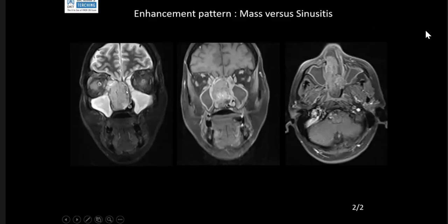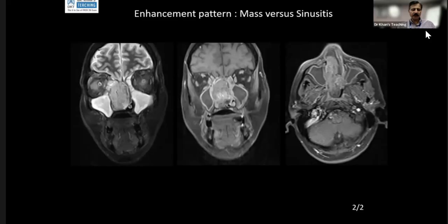This is actually the nasal, so the nasopharynx. This is, I thought it's a nasal cavity. Nasal cavity, yeah, okay. So the soft tissue in the nasal cavity, I'm not sure. It could be a lesion there.